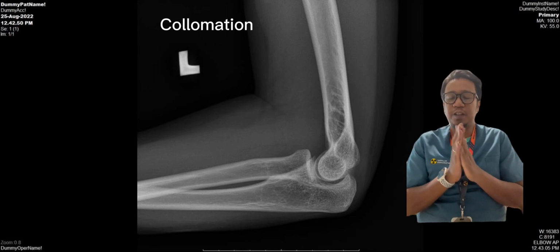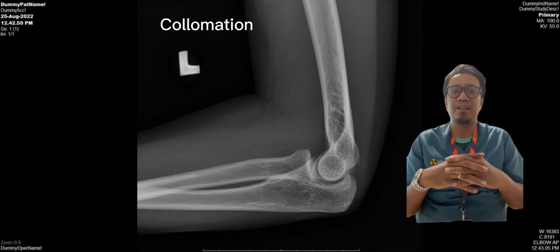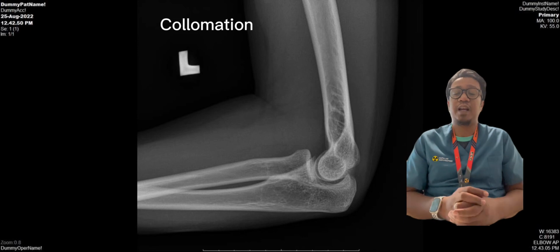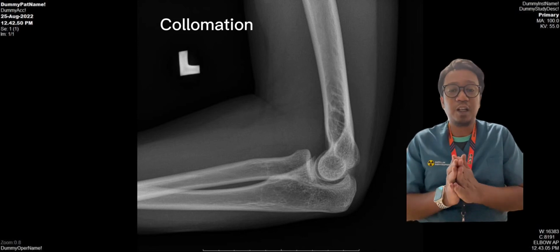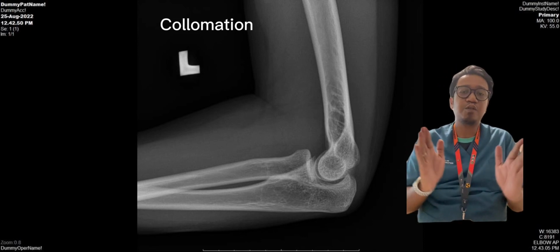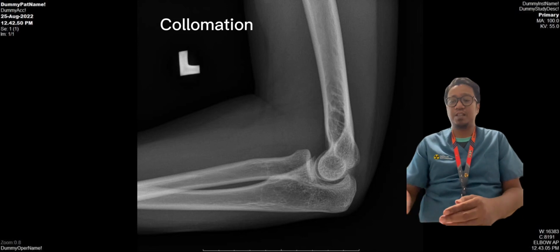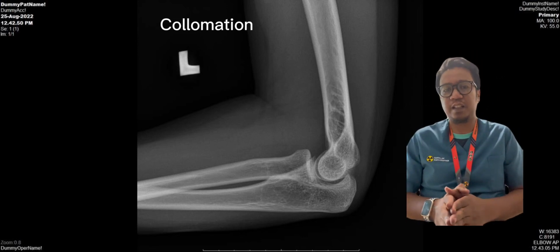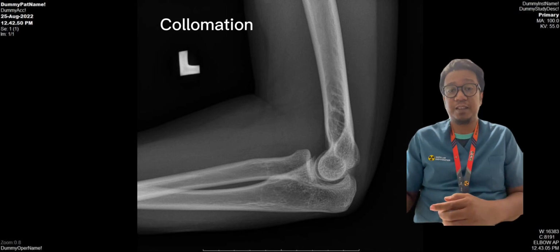At the inferior border of the collimation, the structures that should be included are the skin margin of the radius ulna, the ulnar bone, and the olecranon process. Make sure the collimation is not too big or too small so that it does not cut the region of interest. And for this radiograph, there is no evidence of radiation protection demonstrated.